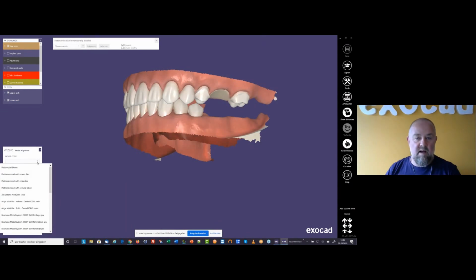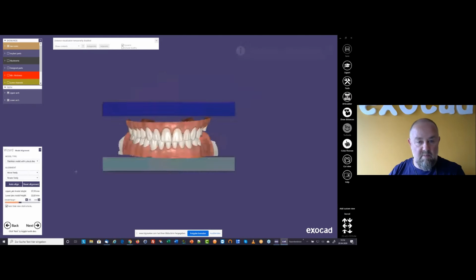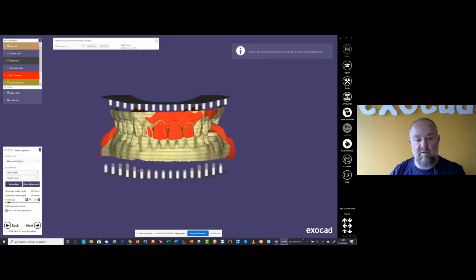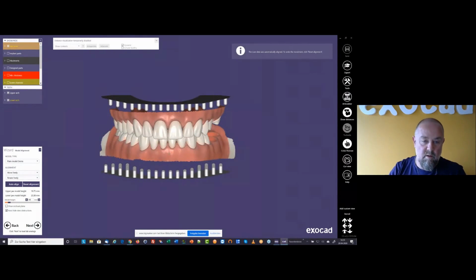In fact, there are two different types. We can choose a model without a plate, so it's just a flat model with a closed bottom. It can be hollow, and the dies can be detachable. Or we can choose a model with plate, for example, if you have a Baumann plate, and then you section the model and create single parts which will be put onto the model plate.